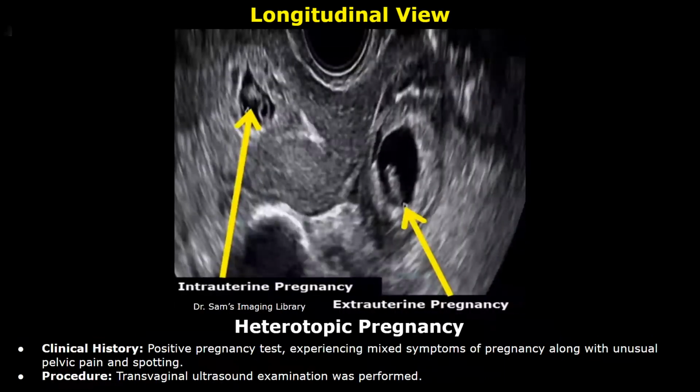This is a report for heterotopic pregnancy. It is very rare. Clinical history: positive pregnancy test, experiencing mixed symptoms of pregnancy along with unusual pelvic pain and spotting.